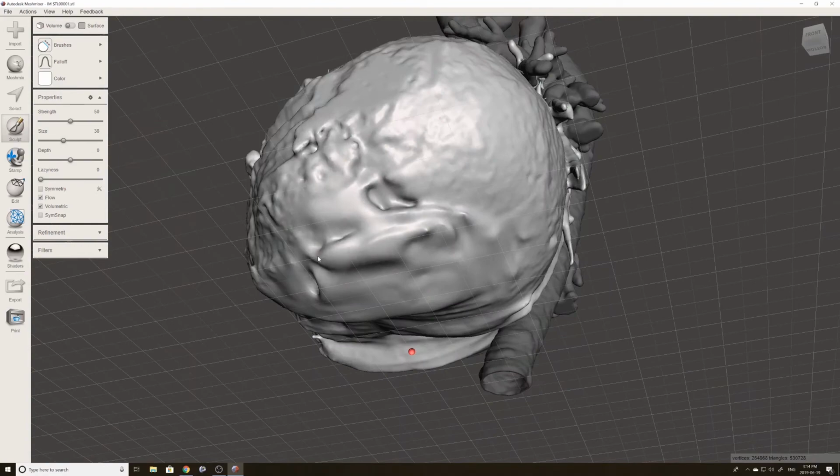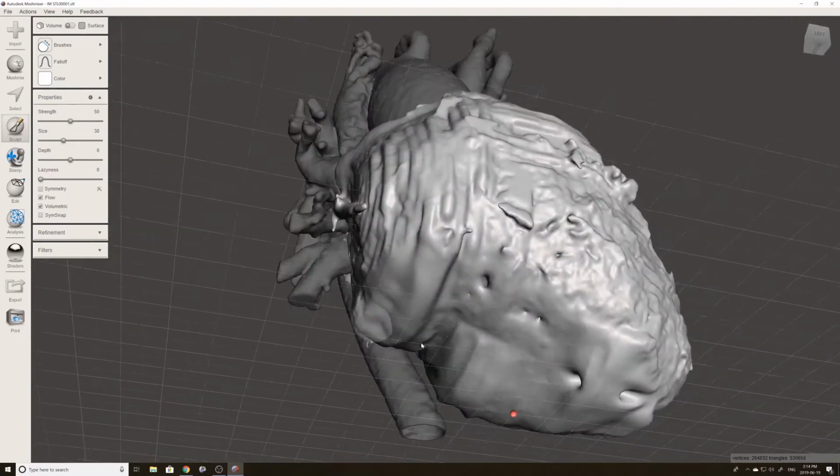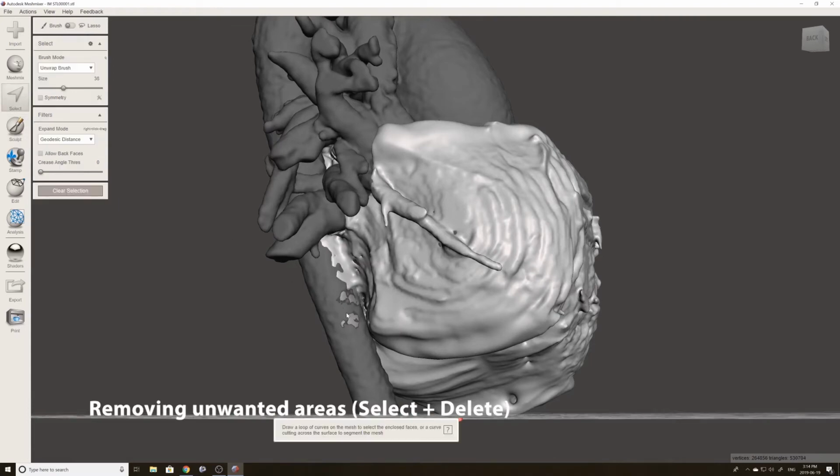And for some of them where we are just printing an arch anomaly, we are just printing a hollowed out blood pool, which is a lot quicker because you don't have to segment out that myocardium and you don't have to go through this editing procedure. You can just have that offset and hollowed area in the blood pool as the model.